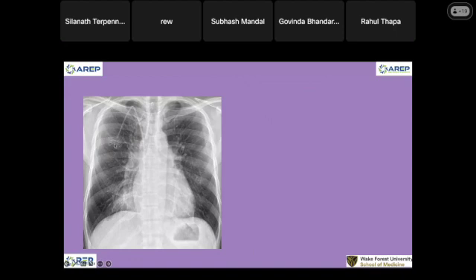Is the pulmonary venous vasculature very prominent? Look at the pulmonary vasculature. Probably pulmonary edema, or something here. The jugular vein is coming down to the SVC. Is it noticeable here?